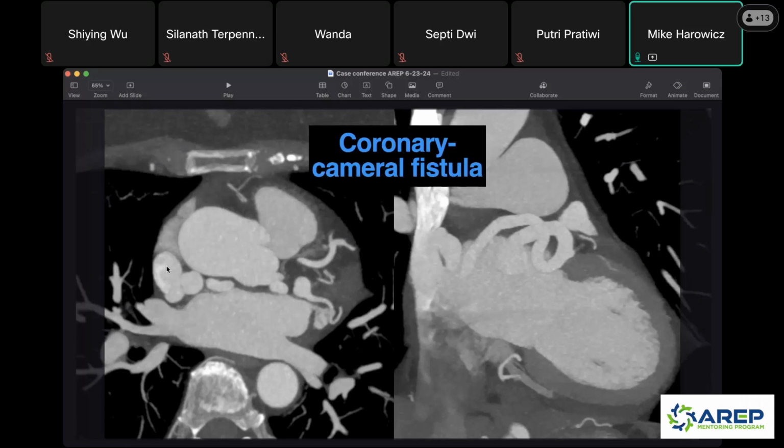And because of that, your pressures are going to be very different, right? The flow is going to be very different. And that's what causes those coronaries to diffusely dilate like that. So when you see big coronaries, if they're sort of diffusely big, I worry, is there a fistula somewhere? What vessel or chamber is this thing hooking up with that it shouldn't be? And often it's very hard to visualize. You either have to scroll very slowly and sort of trace out the vessel, or you make these big maximal intensity projection images, which could be very helpful.